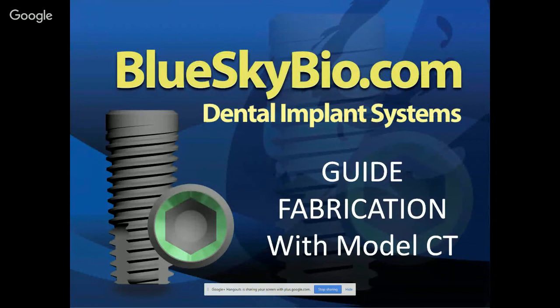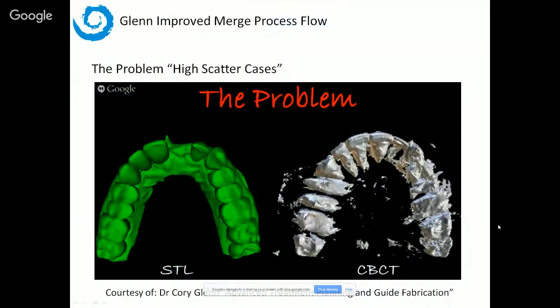The last process flow that I want to go through for the presentation is a process flow that enables an improved merge and improved stitch. It's going to add another step or two to the process, but especially for high scatter cases, it will ensure that the merge is spot on. And we'll demonstrate in the process flow that you're not merging in a situation where there's scatter, but you're always merging to very clearly defined points.